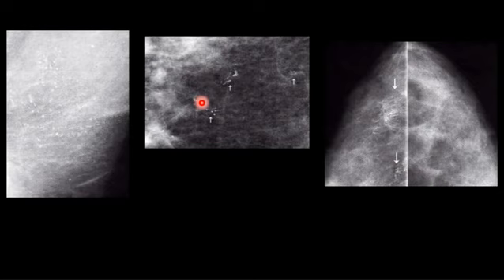Okay, and here it's a different patient with hair, just a few hairs on the breast tissue. Okay, they appear like this, a confusing appearance. So you might even need to examine the patient yourself. Bring her to the examination room, and examine the area that looks suspicious on the mammogram, see if there is anything wrong there. Okay?